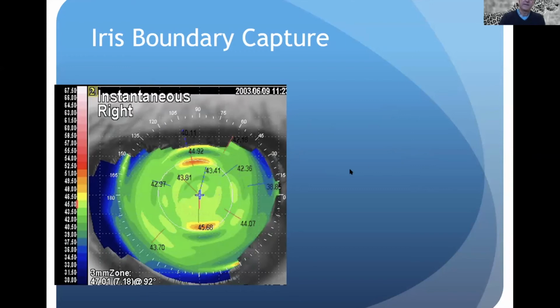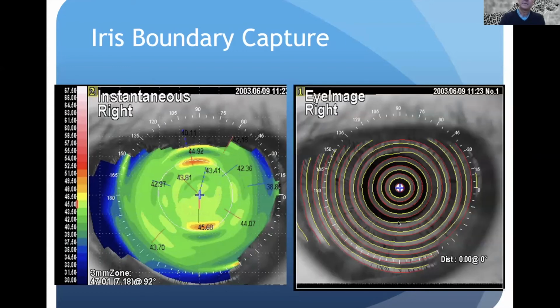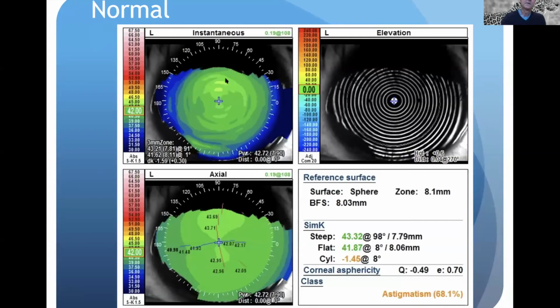And if we look at the Placido rings, particularly with the overlay of how the computer has gathered the information, the computer has skipped a little bit here, probably confused by the image of the pupil, and has given us these two funny looking red spots on the topography. So here once again, we're just going to go back to a normal map.